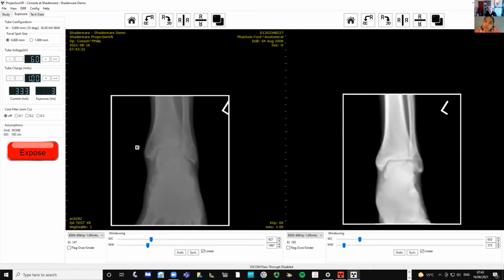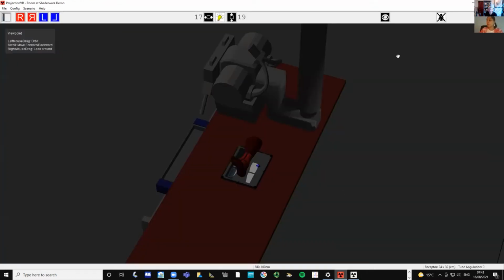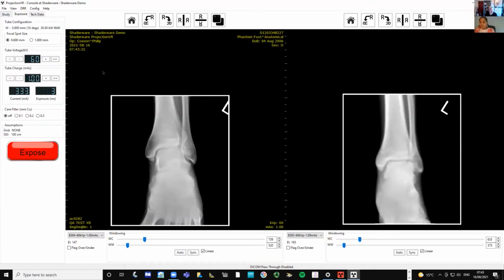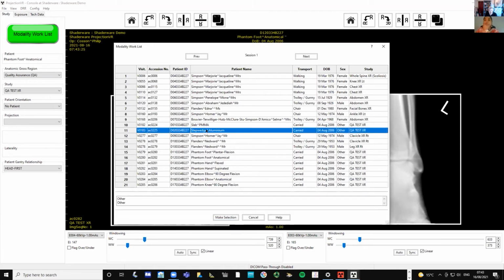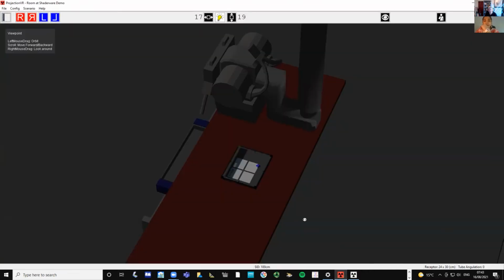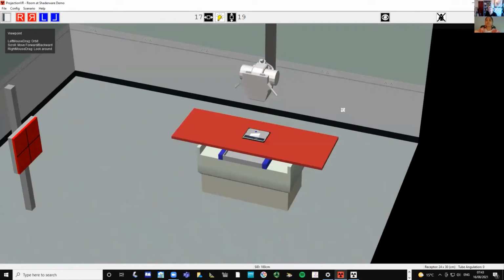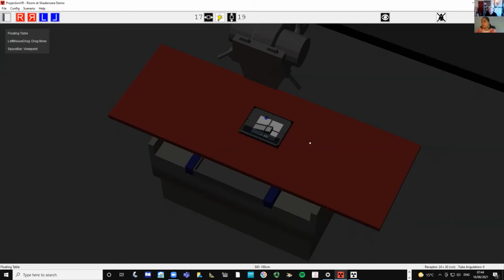This can also be, correct me if I'm wrong, if we're going to use phantoms, there are a series of phantoms available. So this can also be helpful in the quality assurance and the quality control class. Yes, absolutely. So we have a step wedge. Here, for example, we've got the aluminium step wedge, and we also have a slab of acrylic. Because you've got a live lab, you can go and buy a slab of acrylic plastic, which is cheap, and you can then compare.